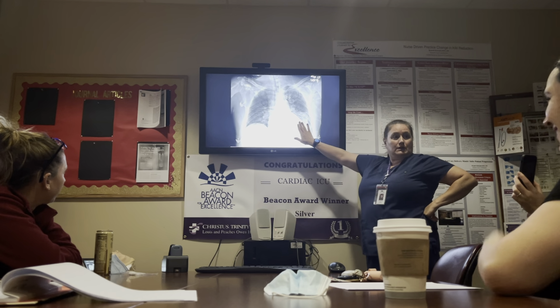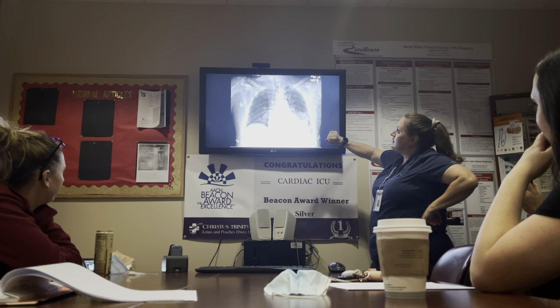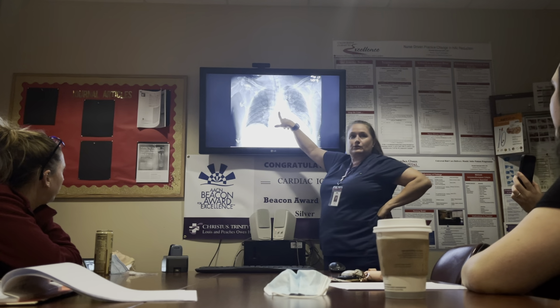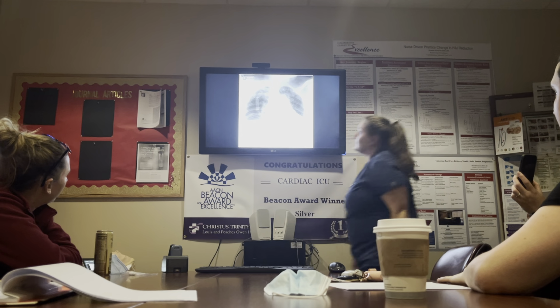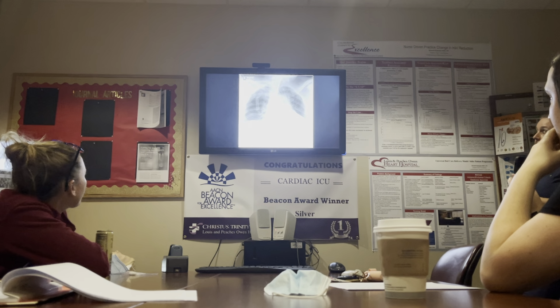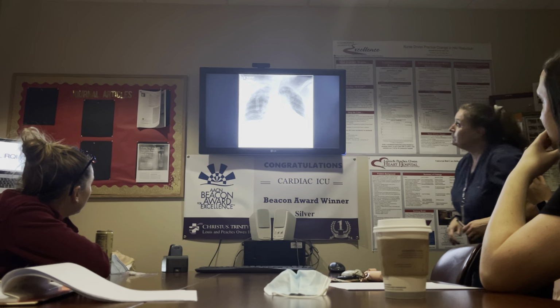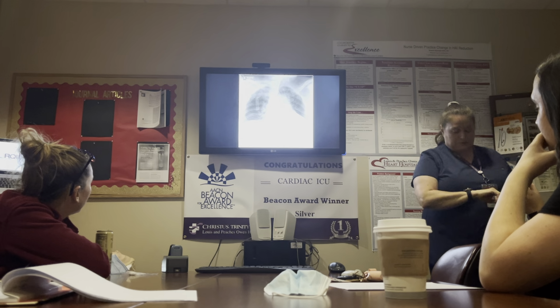You know something bad's happening. We've got pads on the outside of the chest. Patient is intubated. Patient has a central line. Another Impella device, okay? All right. What's this? Big heart, there are devices in there. Yeah, there's a line of staples. So what else has been on there?